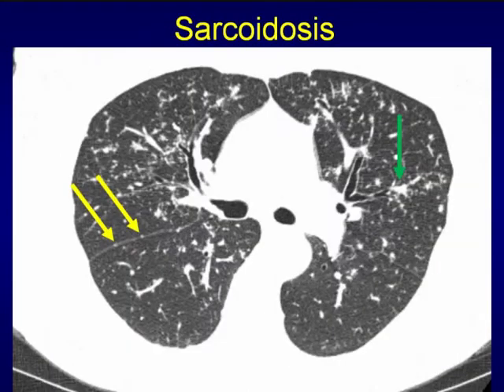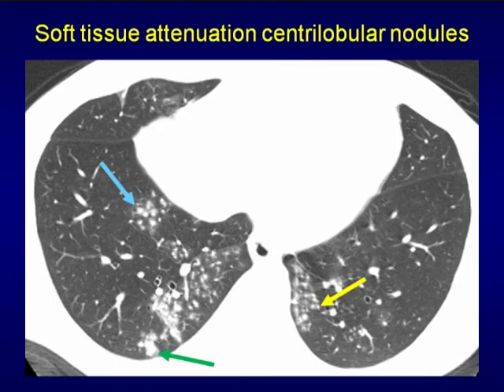This patient actually had a follow-up which was totally stable, so we recommended a high-res CT, and there are clearly subpleural nodules which you should not see in patients who have tree and bud. So this was a patient with sarcoidosis who also had some peribronchovascular nodular thickening. Okay, so just don't make that mistake. Be specific. Now, not all patients with pneumonia will have tree and bud.